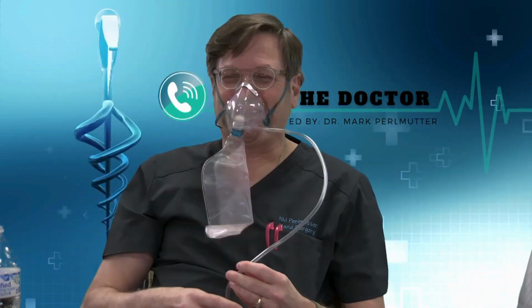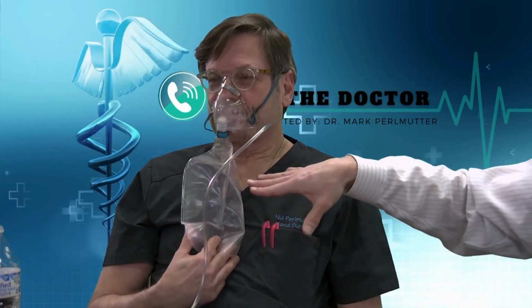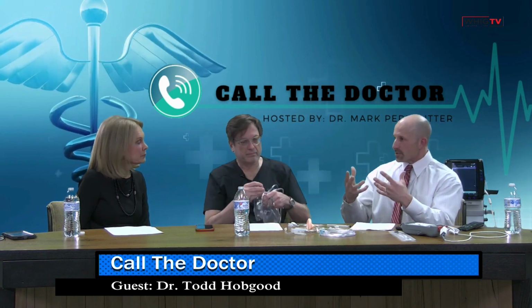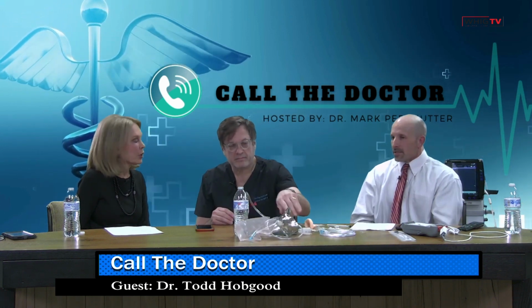Yeah. And then this is just like the bag that'll drop from the top of an airplane if you have trouble. And what goes in here? This is a reservoir that fills with extra oxygen to supply a higher concentration of oxygen to the patient while they're breathing. Okay. Because we're sedating patients, even though we're not doing general anesthesia, the breathing rate does slow down a little bit and it becomes more shallow, so we want to make sure that there is an adequate supply of oxygen there for them. For their heart and all safety.